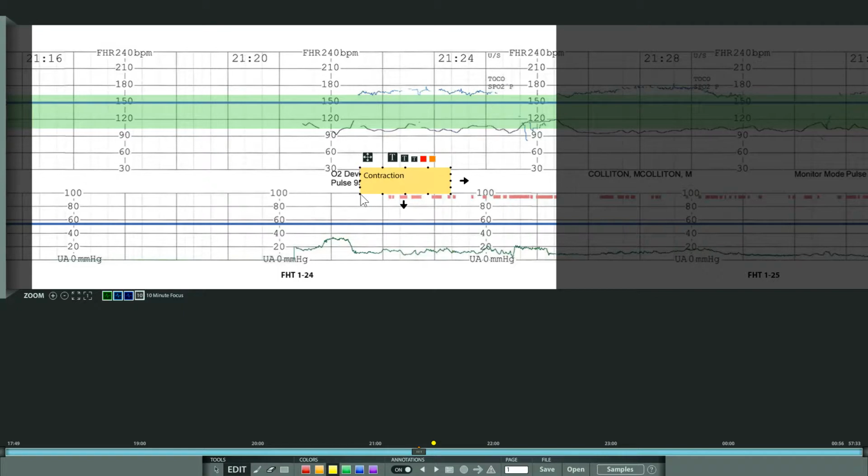And then I'm going to be able to choose one of these black marks, kind of like the border marks here, and I can end up pointing over to certain areas. So if I'm going to point to right here, I can actually expand these as well. I can move this box wherever I need to. I can change how big the font's going to be, as well as the color. So this is really helpful if you end up having a series of different experts or two different nurses that have different testimony or different notes on here. I could also toggle that off and on.